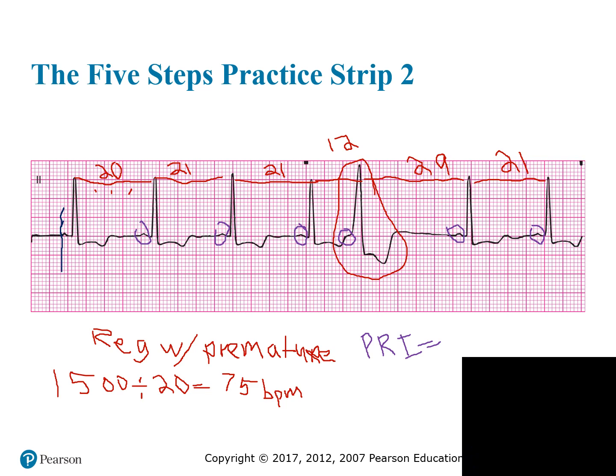So we have an understood Q, so we're going here. And I should draw this in red so you can see it a lot better. Come on, draw straight.